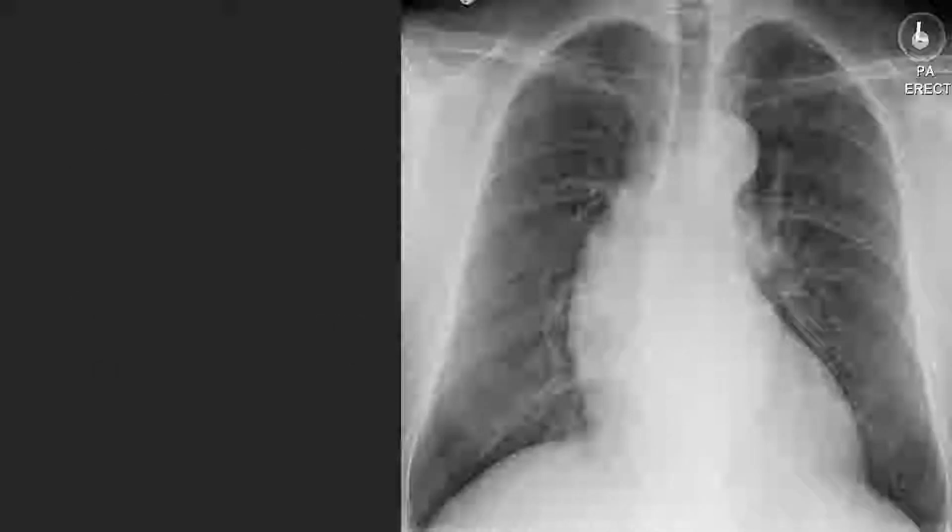Let's look at a similar appearing case. We can again see that the ascending aorta extends beyond the right atrial border and that the descending aorta is going off the spine. The aortic knob looks well formed in this case. This looks less ominous than what we previously saw. However, this patient had a history of Marfan syndrome and is presenting with acute chest pain. This raises concern for dissection.